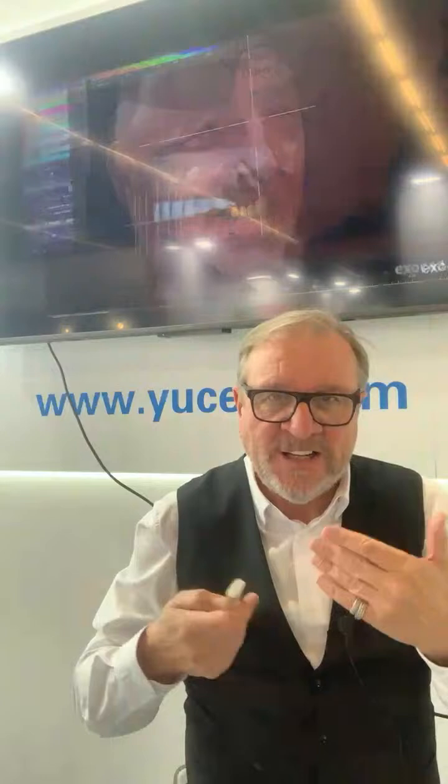This is the more important thing because this is the information to put the virtual articulator on it. If you put the virtual articulator on it, you have such the information. So we have it in 3D and we make exactly the same workflow. Exactly the same workflow. And I have also such a result. I can also share with the patient, and it's very interesting.